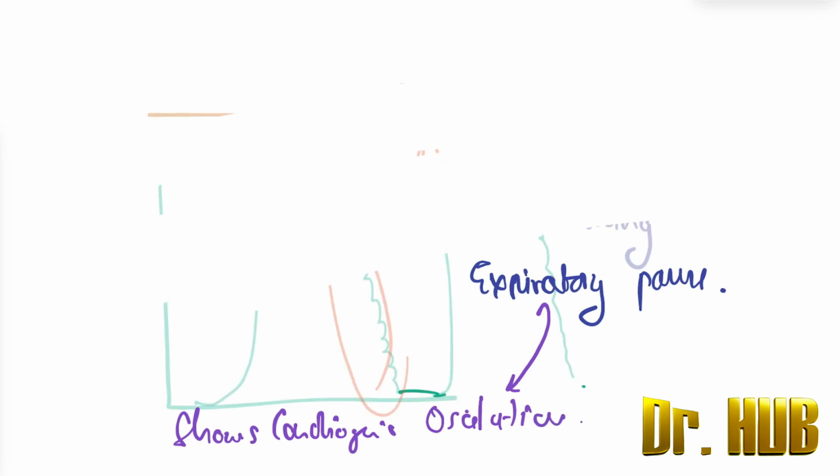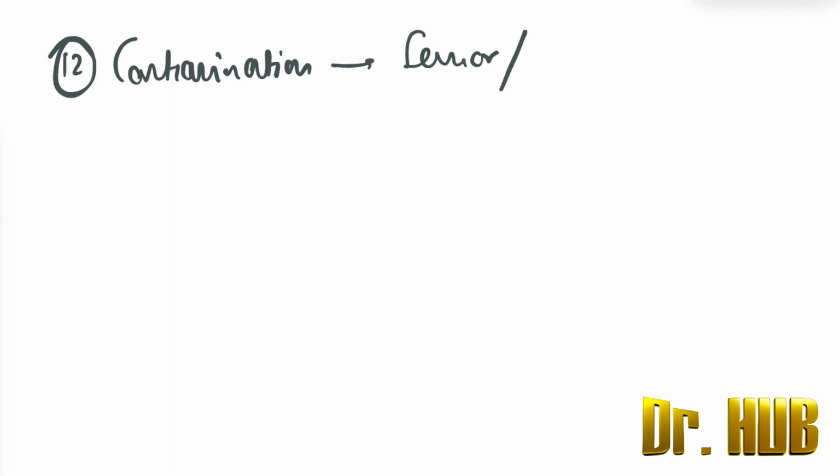Then we move on to number 12. So number 12 is nothing but the contamination of the sensor or the soda lime exhaustion.